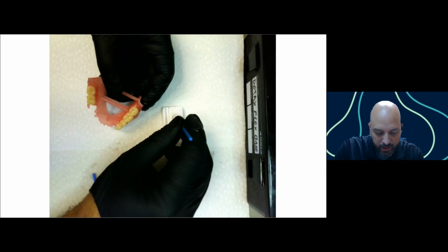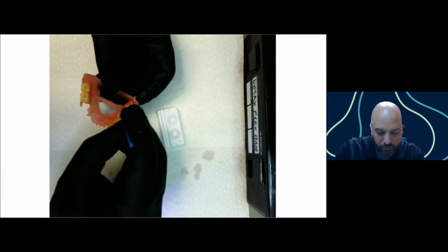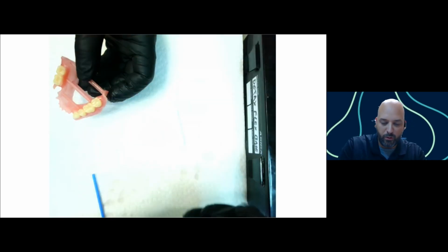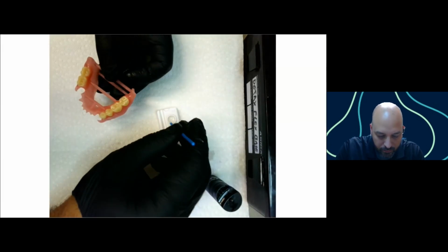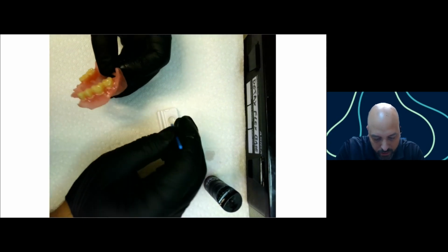You can get them on Amazon, there's like a 200 pack that you can get for like 10 or 15 bucks. But this material is really nice because it'll help fill in any little crevices or things that you might have missed with the bonding agent. So I just use one of these little disposable thimble things and put some of it in here. That way I don't waste a whole lot, because this stuff can get pretty pricey depending on what glaze material you decide to go with.